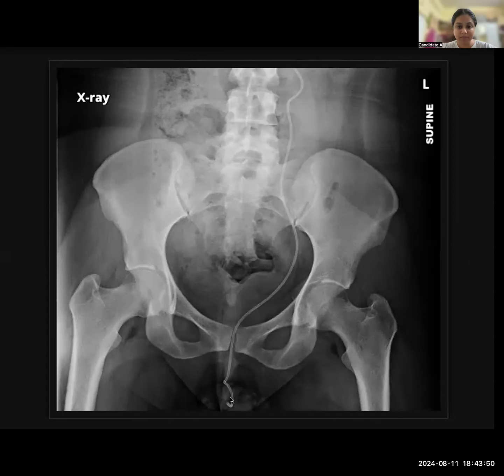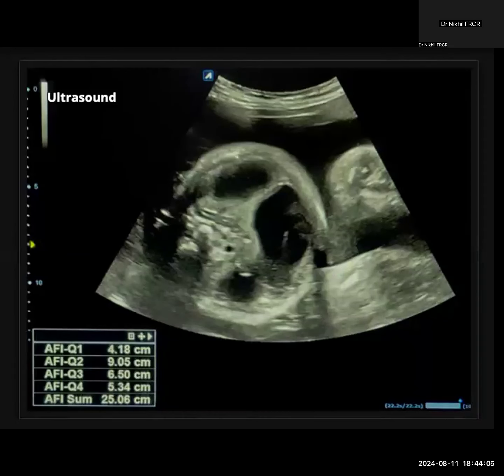Okay. So oftentimes you might not get a very tough case. It would be a very straightforward case. All it needs is a bit of understanding of what you should be looking for. So when they tell you some renal procedure, always look for something like implants or lines and tubes. Okay.